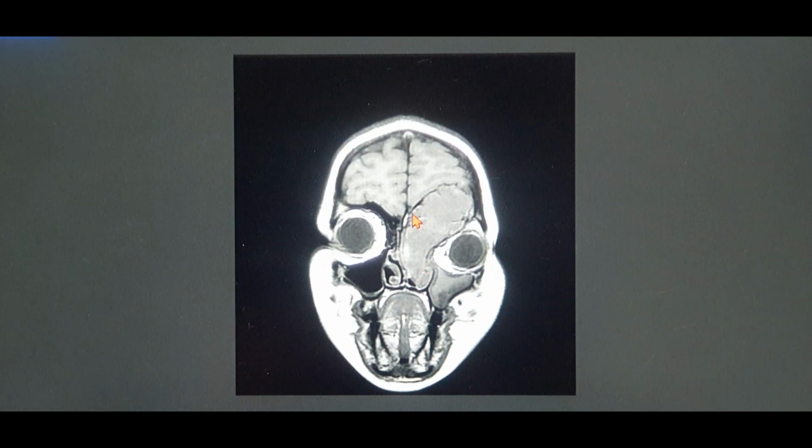You can see over here a huge frontal mucocele, which is also iso intense on T1. Normally, had this been full of clear fluid, it would still be dark on T1, and on T2 it would be bright white. So as we spoke about some time back, this has to be hypo intense on T1, which is basically nothing but the clear fluid.